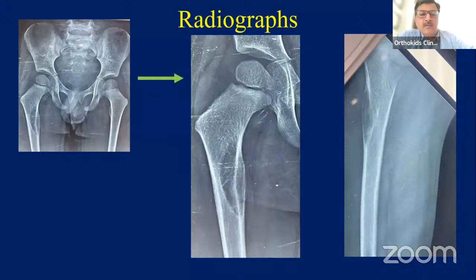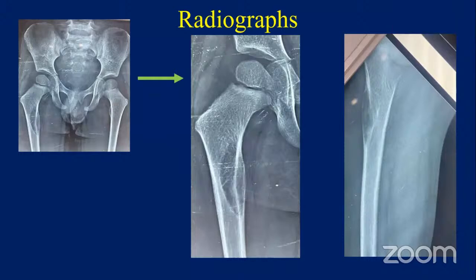Yes, Mandip, what would you want to say? So this is primarily a cortical lesion. That is what I can see from the X-ray. This is a cortical lesion with scalloping of the cortex on the endosteal side. I don't think there is medullary involvement here, even on the X-ray, because the inner zone of transition is also very sharply demarcated with some sclerosis. So I think this lesion is buttressing the inner cortex towards the medulla, but there is no medullary involvement. Of course, MRI will tell us exactly what it is, but this is what I can see from the X-ray.